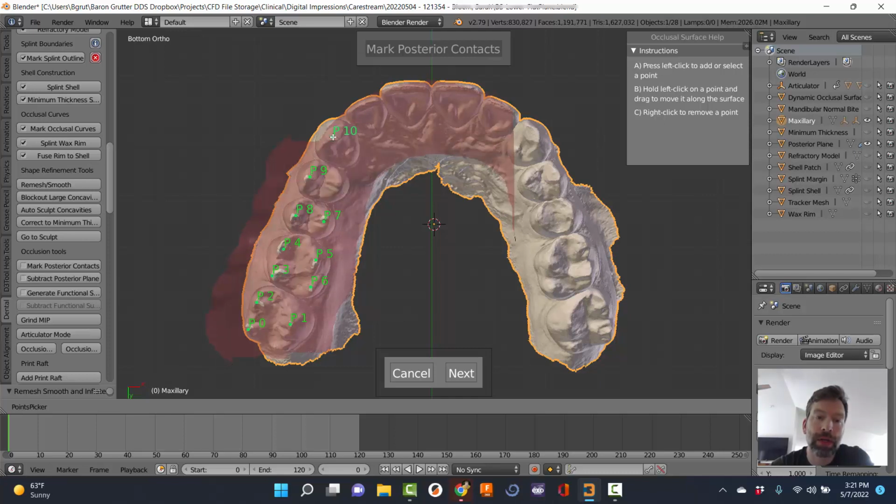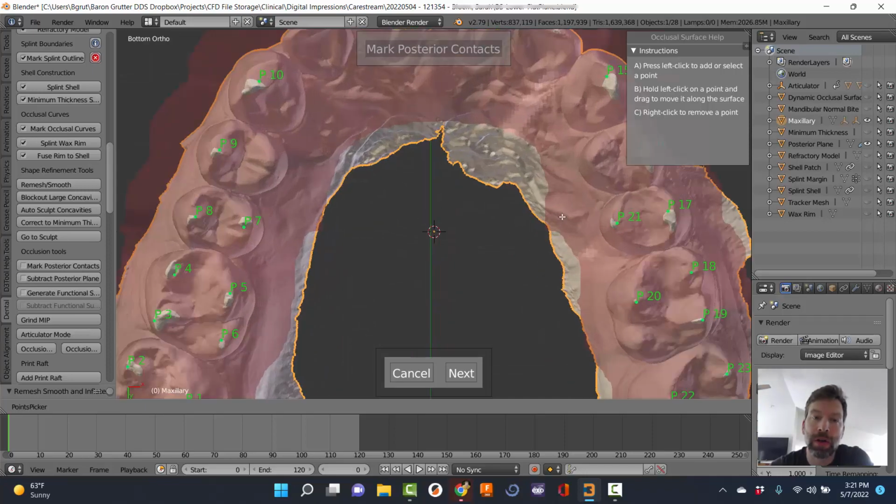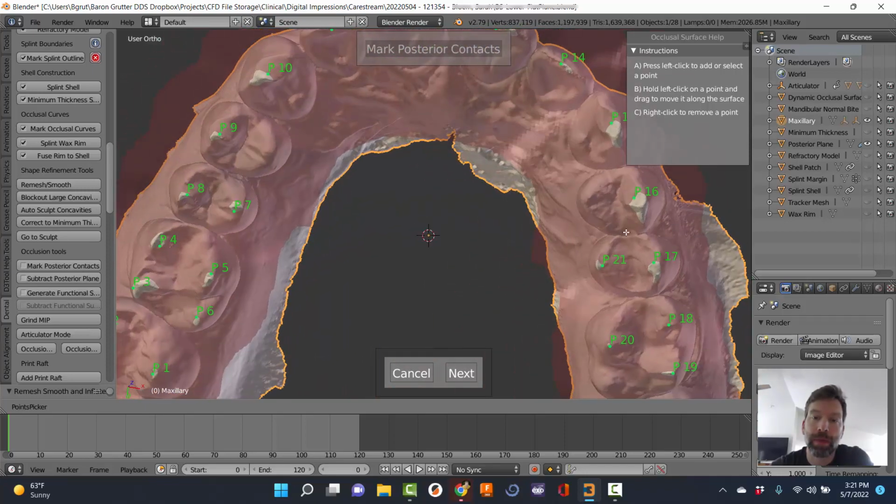And what a lot of people fail to understand or to explain is, like I never learned this in dental school, but a flat plane appliance is not flat. It's just flat to the occlusal plane. And what I mean by that is if you were to set this model on a counter, it would rock all over the place because the teeth are not all in the same plane.